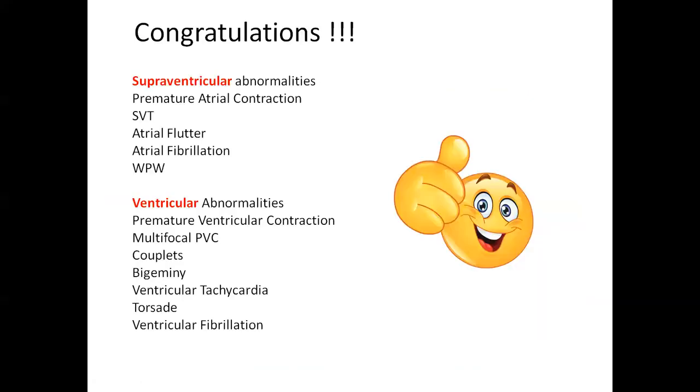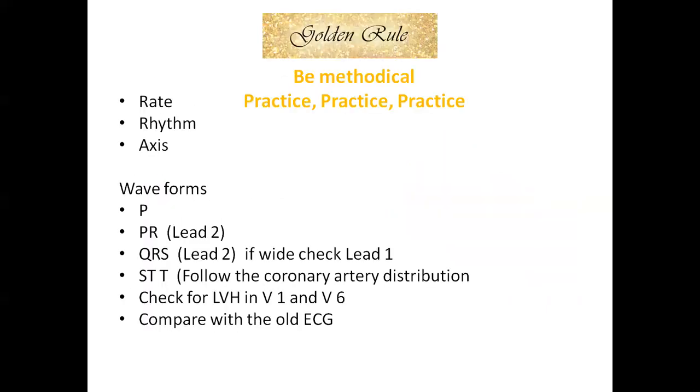So you learned a whole bunch of stuff. And congratulations, now you need to build up on this, okay? Go and look at this many times and understand all these rhythms that you learned today. And let me summarize how to read an ECG.